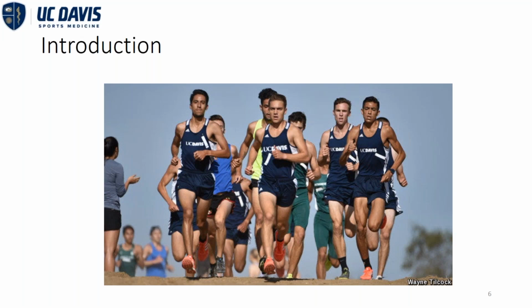Part of the talk is going to be trauma-based, but part of the talk is really useful for just people exerting themselves. I got to tell you, some of the most exciting ultrasounds I've done on the sideline have been actually at marathons and cross-country events where there's no contact whatsoever, and you have a collapsed athlete and you want information as soon as possible.